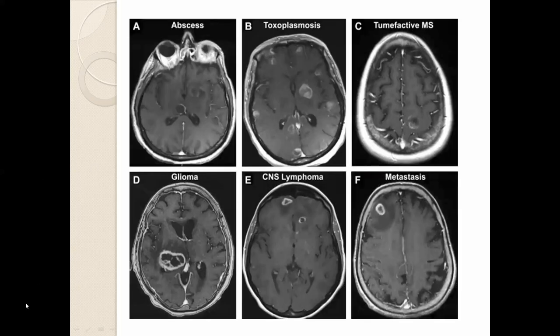Again, these are the pictures which are showing multiple ring enhancing lesions. Coming to picture number 2, whenever there are multiple small lesions that are enhancing, that could lead to the diagnosis of toxoplasmosis, whereas when you compare it with picture number 3, very deep-seated, minute, small, these can be large.